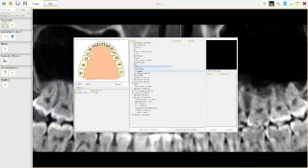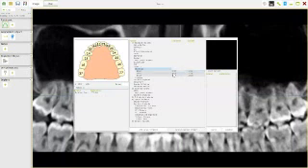And basically the UZ implant, the thread's pitch is slightly different. So if I click onto the BioThread, it's got the different lengths and sizes, 3.25 diameter by 10, 3.25 diameter by 12, 3.25 by 15.